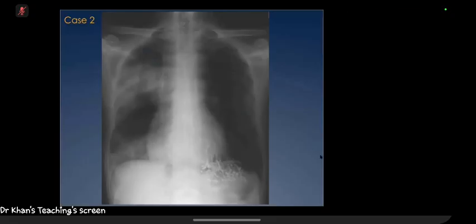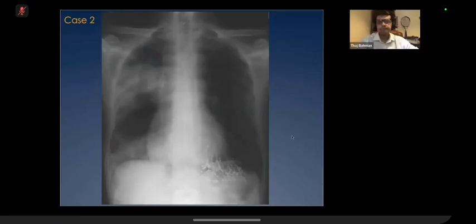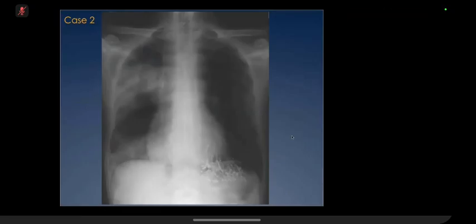So, frontal chest radiograph, skeletally mature patient. I can see 3 abnormal areas: one projected over the right mid-zone, right lower zone, and left lower zone. The right-sided abnormalities have a cotton wool appearance of airspace opacities.